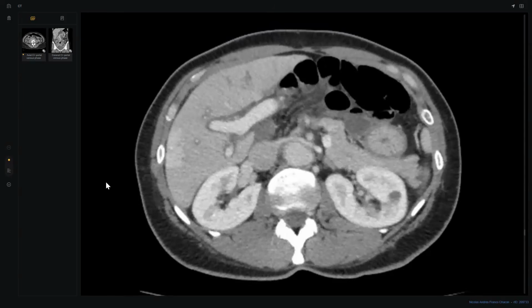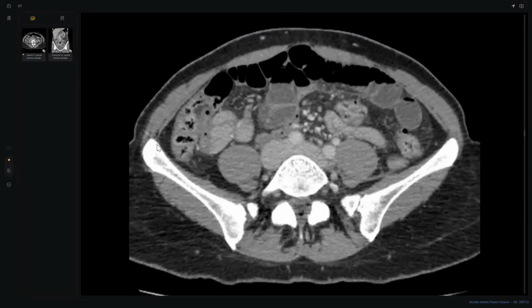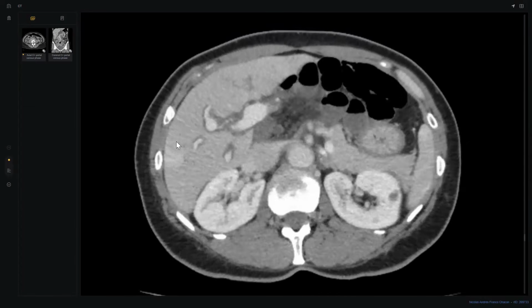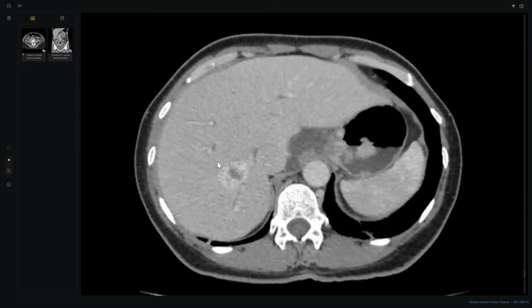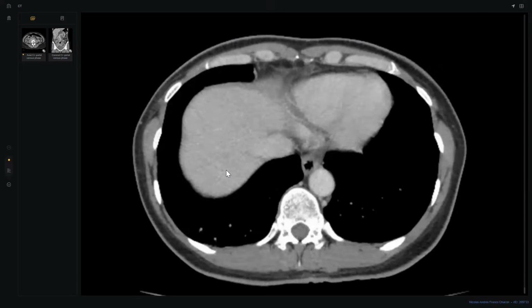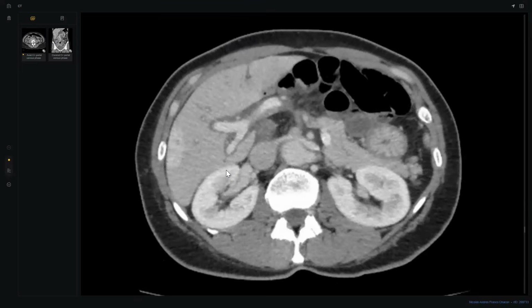What's your final diagnosis? Regarding the liver, I'm not sure. At least, see what happened here. This is subcapsular, could be a transient hepatic attenuation difference with no mass effect. What is this also? Benign or malignant looking? I think it's a hemangioma, but I would check it in the arterial phase also.